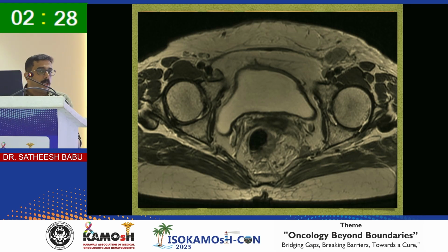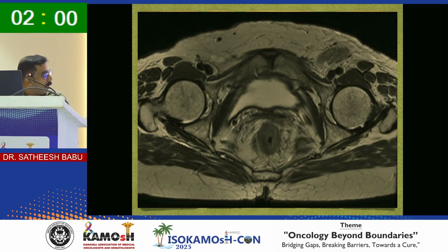This is involved. So the distance of the tumor, node, or any infiltration, or even EMVI, 1 mm or less than 1 mm towards the mesorectal fascia is taken as infiltration of the mesorectal fascia. So 1 mm or less than 1 mm is taken as infiltration, either it's a tumor, node, or whatever it is. And you have to look at this fascia, so if there's a node outside this fascia, that's an extramesorectal node. So there are criteria to define the node that will come later.